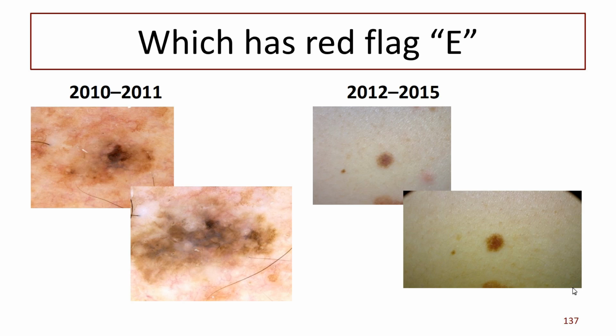So melanoma can grow quickly. But actually, melanoma can grow extremely slowly too. And we might see something like this looking almost the same a year later. So we just have to be a bit careful of that. Should we have removed it in 2010? Yes. Why didn't we?